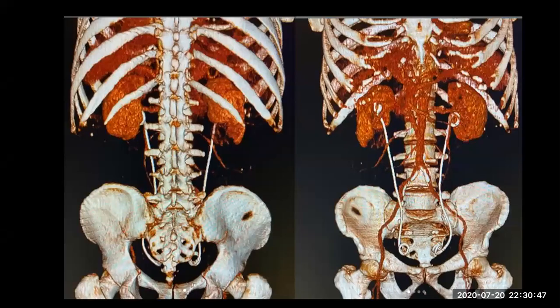Next case, what is this? What is the name of the procedure here? DJ stents bilateral. Okay, what is the name of the procedure? 3D CT volume rendering technique, showing a double J stent bilaterally. Okay, very good.